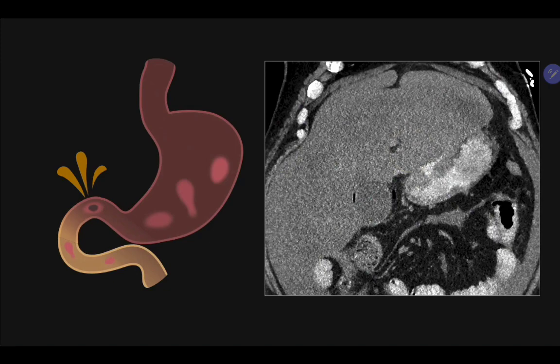Oral contrast can be great for helping you to find the ulcer crater and should be considered for your initial exam or for problem-solving tougher cases. It is helpful even if the patient is able to drink only a small amount. In this case, oral contrast is leaking through this antral defect and coating the lower liver edge.